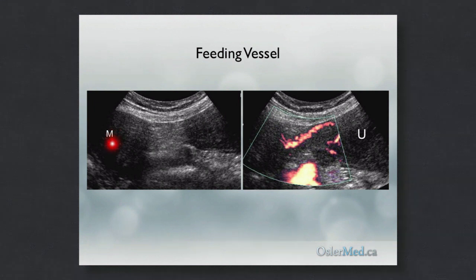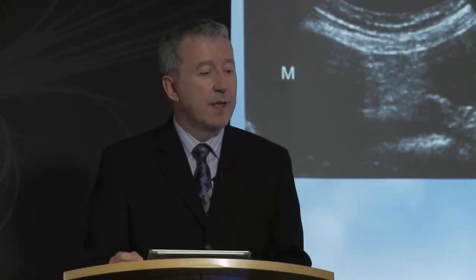Again, the question arises, is that an ovarian mass or is that mass arising from the uterus? And when we add color Doppler, we can see this feeding vessel coming from the uterus supplying the right ovary, or the right solid adnexal mass. The ovary was demonstrated separate from this mass. Where Doppler is not useful is analysis of the spectral tracing.